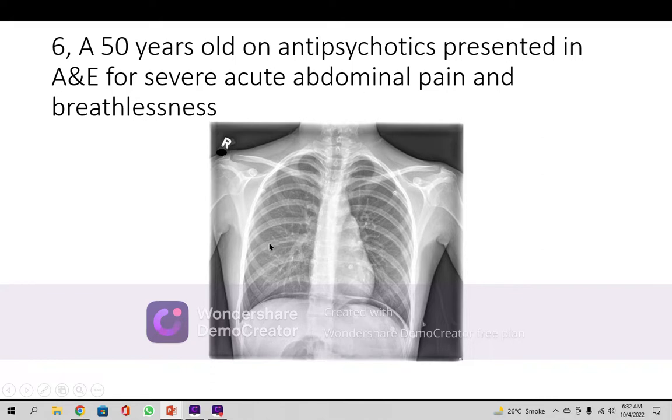Yes, he is standing, but he is not still because he is slightly moved towards the left side. So he is not in the straight line, probably because of pain in the lower part of the chest or the upper part of the abdomen.